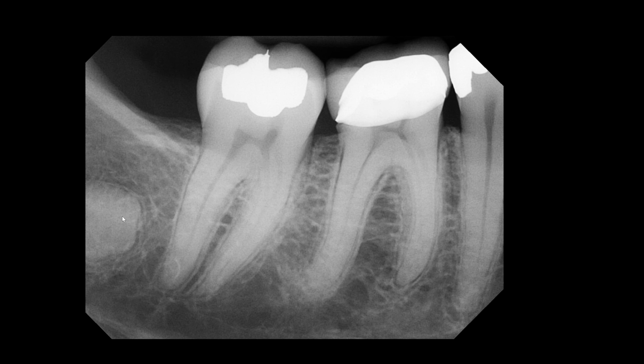If your eyes were fixated only on the margins of crowns and root apices of these erupted teeth, we definitely need you to look at the rest of the periapical radiograph. It is so easy for us to just look at the teeth that we are treating in the clinic, but forget to look at the rest of the radiograph.